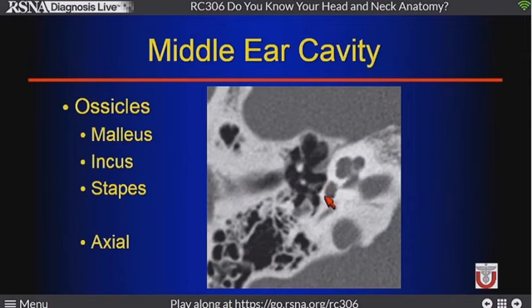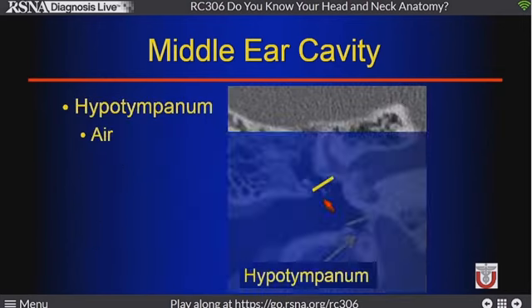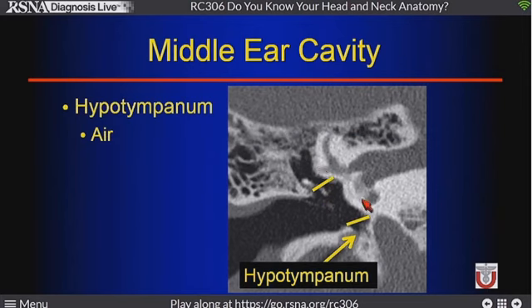We want to be able to see those well on our CT scan, and we want to get thin enough cuts so that we can differentiate the anterior and the posterior crura. If we see them too well, we're sometimes suspicious of something like long-term infection like tympanosclerosis that may be scarring and holding those down. But if we can see both the anterior and posterior crura well, we think that's a well-done CT. So epitympanum, that's where the ice cream cone lives. Mesotympanum, that's the middle.